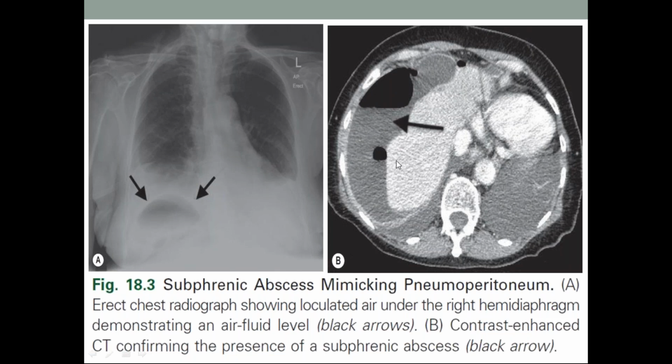Completely below the diaphragm. This is the subphrenic abscess. It will mimic a pneumoperitoneum.